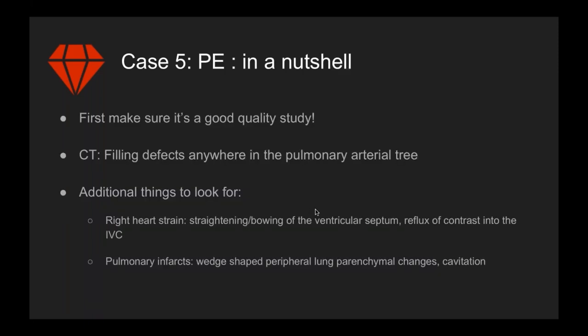The first thing, just a few pointers for anyone looking at CTPA maybe for the first time. Obviously, you've got to make sure that it's a good quality study. On a CT, what you're looking for is any filling defects anywhere in the pulmonary arterial tree. And I definitely look at it in all 3 planes and just scrutinize every branch of the pulmonary arterial tree.